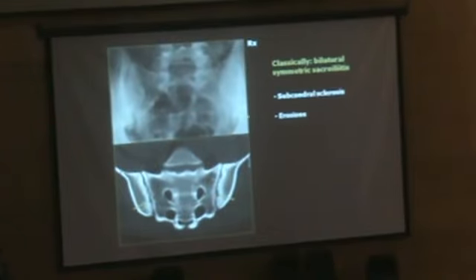We can see also erosions, and you see it's pointed by the arrows on X-rays and especially on CT, because we have high resolution in cross-sectional imaging. It's better to see erosions. Widening or narrowing of the joint. Such widening can be seen especially in the early stages of sacroiliitis, especially in the inferior aspect of the joint, where is the synovial part of the joint, and we can see some joint fluid in there, making the joint space wider than the rest of the joint.